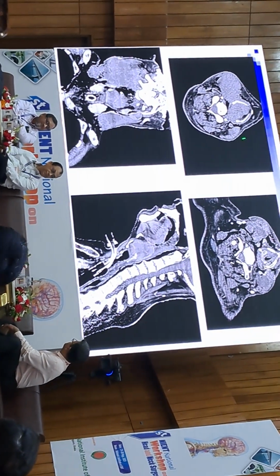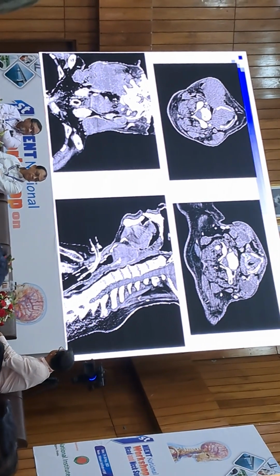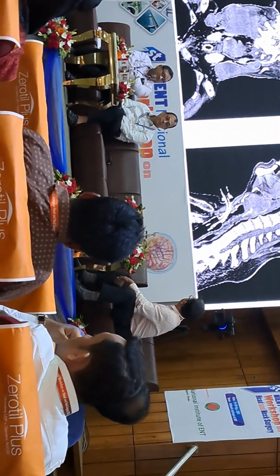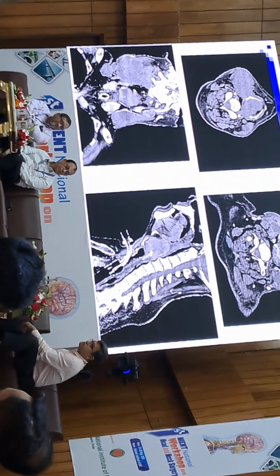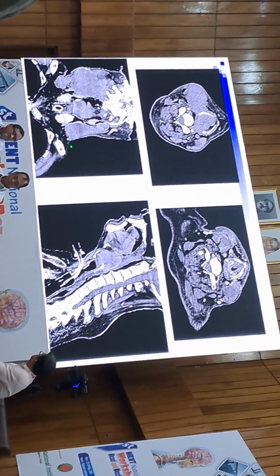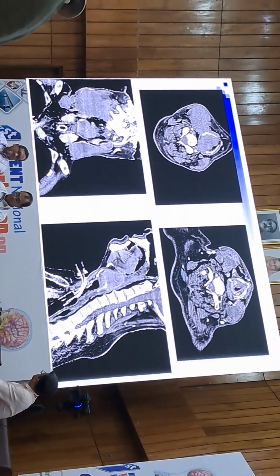Here is a supraglottic and glottic tumor, both the supraglottic and glottic areas are involved, but we see there is a subtle lesion of the right lamina of the thyroid cartilage with mild paraglottic extension. This is a T3 tumor. We see the patient has a tracheostomy, and there is a huge air density area within the cervical tissue bed. The patient developed subcutaneous emphysema during tracheostomy.